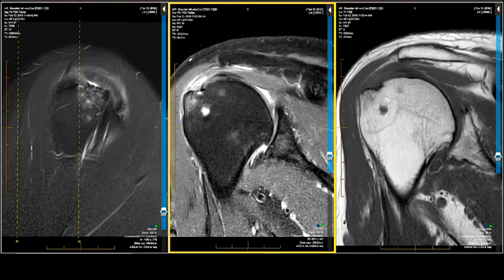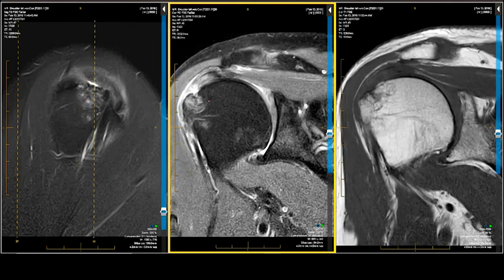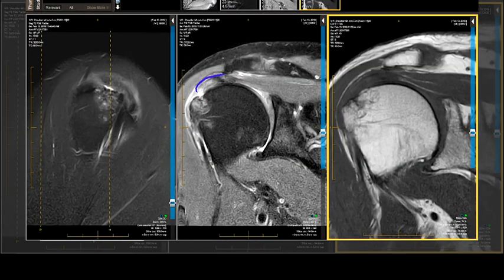I mean, how did this patient get this tear? Probably as a byproduct of his trauma, but his trauma didn't cause all these cysts. They've been there for years. So he was an impinger to start with. He probably had tendinopathy and a degenerated tendon as a result, not of bone, that is not bone. Look at the T1, maybe a little bit of bone. Maybe a little bit right there. It mostly is the coracoacromial ligament pressing down on that. Well, you might say, why isn't it pressing down on that? It is when he picks his arm up. Every time the arm goes over the head, this thing rotates right into the CAL, coracoacromial ligament, and subacromial arch, and you get lateral subacromial arch impingement, one of the types of anatomic impingement.